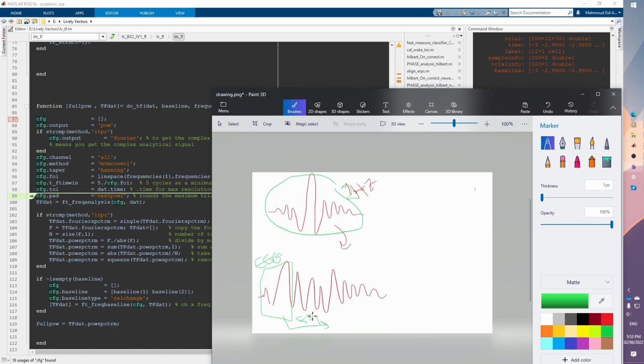transform. And there is one hint that I didn't mention in the Fourier transform video, which is that you don't want to do the Fourier transformation using a for loop and not even a parallel loop. You just need to use the fast Fourier transform because it's much faster and really optimized, so it will be quicker. So anyway, we get this window, we apply the fast Fourier transform, so you would have an estimation for each frequency for this particular window.